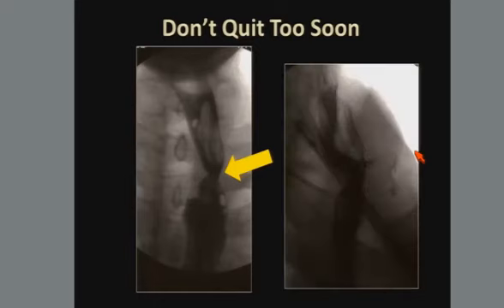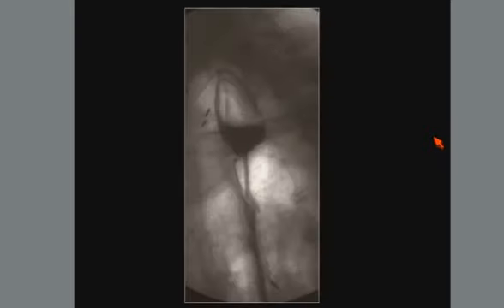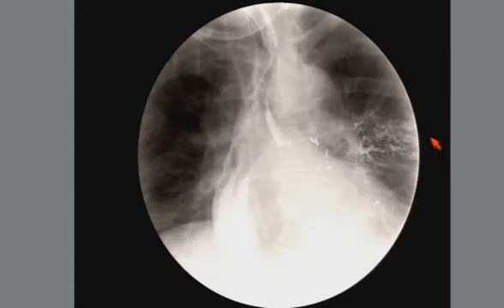and you can see the patent anastomosis here. Only when you rolled them into a fairly steep oblique could you see this anterior leak here. This is a different complication in a patient with gastric pull-up. This is a stricture at the anastomosis, and you can see the jet effect here as the contrast courses through the stricture, the proximal ballooning with the retained contrast.